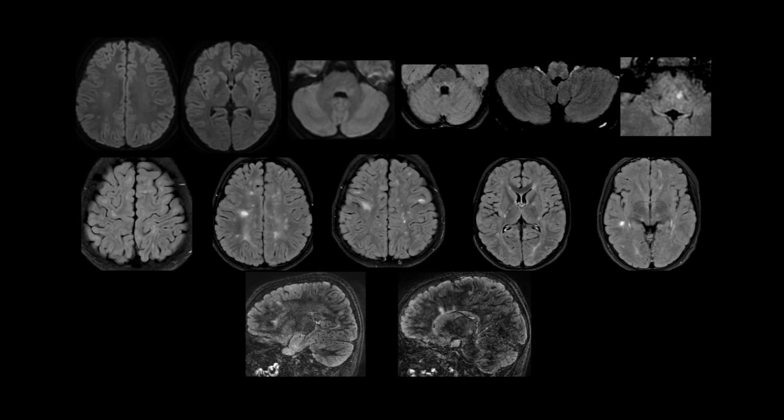On the MR images, there is mild restricted diffusion, though I don't have an ADC, so I'm not sure if there was restricted diffusion or not. But there are multifocal lesions. On the FLAIR, predominantly involving the white matter: bilateral cerebral hemispheres, subcortical and juxtacortical lesions, the central white matter, and periventricular lesions. On the sagittals, you have these perpendicular lesions along the corpus callosum, the pericallosal lesions. In the brainstem, there was a focal lesion in the medulla.